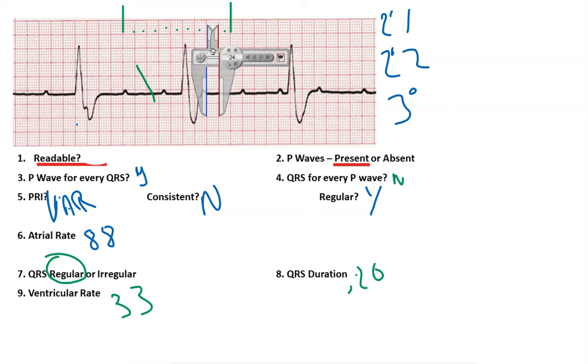Okay, so actually let me erase that because that is what I know it to be. And if it is at 0.20, we know that that is greater than the 0.12, which we've seen before, which is telling me that this is probably something that is coming out of the ventricles, right?